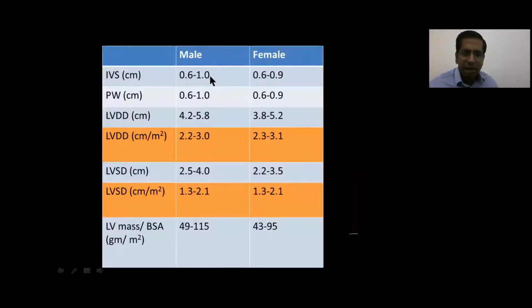We just measure blindly, or we have a preset idea that 12 is normal. But 12 millimeters is not normal. If you actually look at the numbers in the guidelines, then we become even more careful about even measuring 11 millimeters, because 11 is not the same as 13, is not the same as 9. So we have to be careful in how we measure.